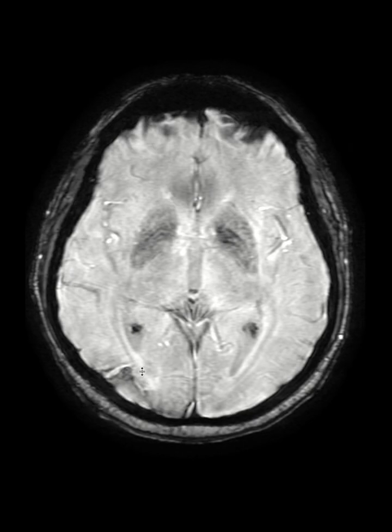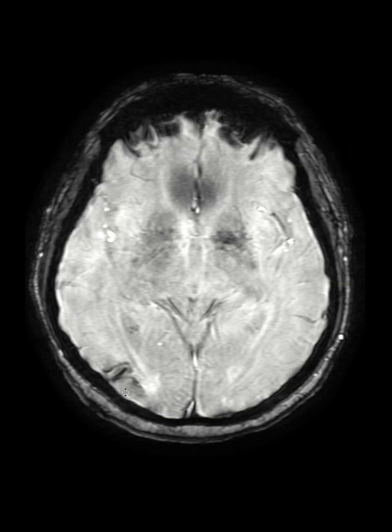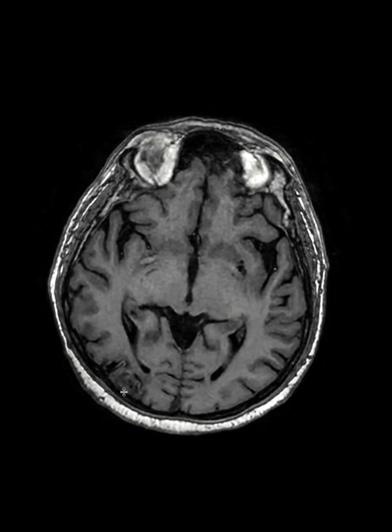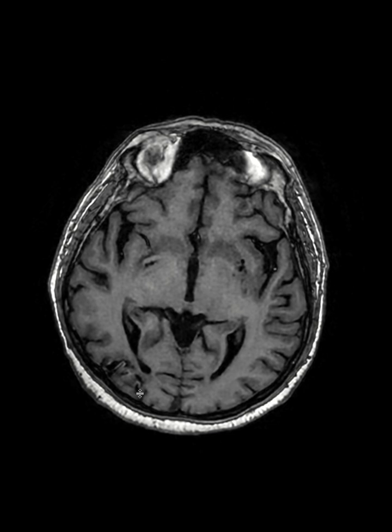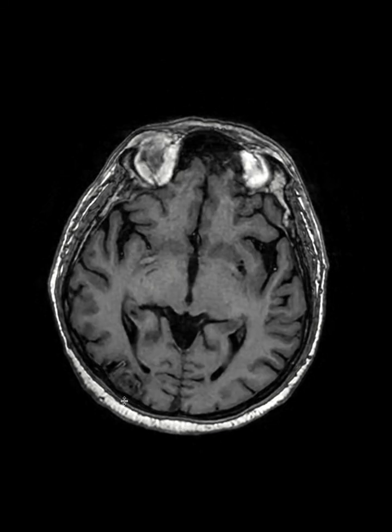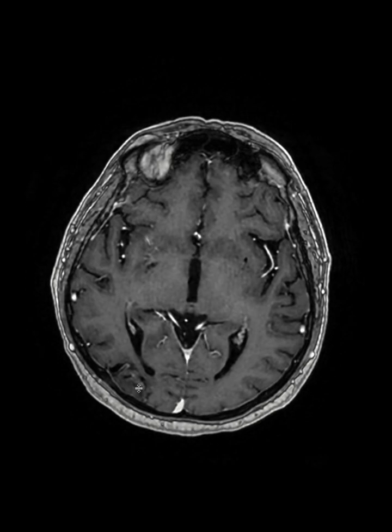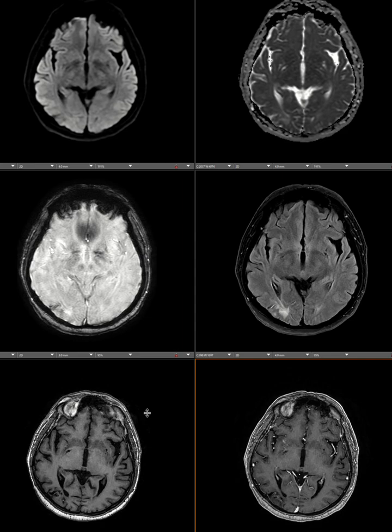We see some hemosiderin staining. So in areas of infarct, sometimes we just see this particular hemorrhage that just shows prior insult in this region. And then if you look at this T1, this is a T1 without contrast. You see that those areas have T1 hyperintensity. This is called laminar necrosis, which is a common manifestation of the chronic infarct. And if I look at the same area, make sure you don't mistake these areas for enhancement because these are already T1 bright on non-contrast T1. So basically, this is laminar necrosis and other manifestations of chronic infarct.